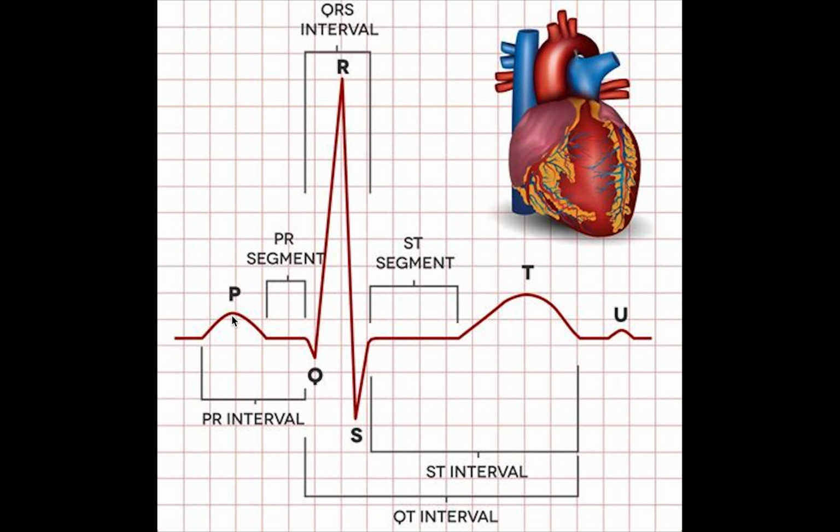So the atria are contracting on the P wave, and then the AV node slows it down a little bit. Typically it's a little longer than 0.12 seconds is what we want to see. And then boom, you see this huge spike, and that's the electricity traveling through that septum in this direction at a very high voltage to stimulate these ventricles to give a good, nice, hard squeeze. Pump that blood out. Then once we go up, well, then we go down. So then when we go down, we actually go negative.